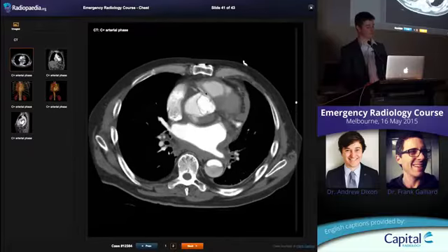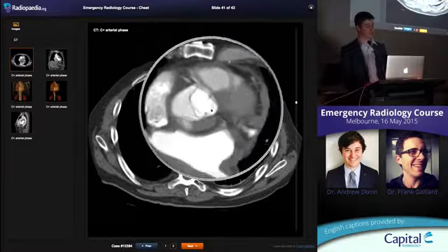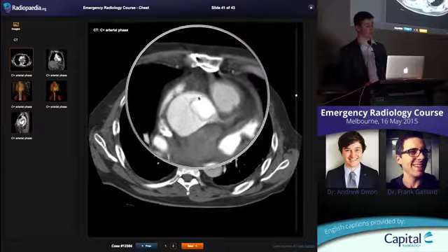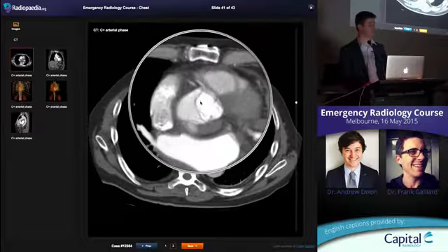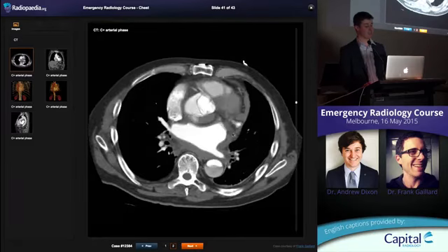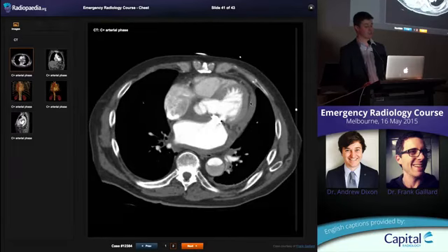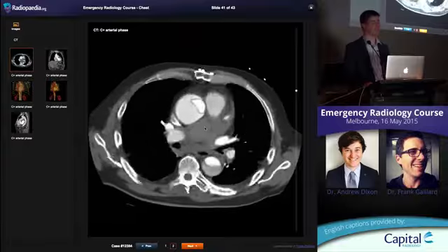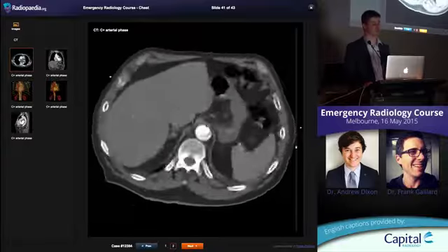This is where your coronary arteries come off. Can you see that little vessel there, right coronary artery, and a left coronary artery coming off here? See how the dissections come all the way back to those, so you can block off those arteries. You can also leak blood out into the pericardial space, which this patient has. See that thick? So that's the wall of the ventricle there. Then there's blood sitting in the pericardial space. So this patient may develop a pericardial tamponade from their aortic dissection. This is pre-terminal kind of stuff, needs urgent attention.